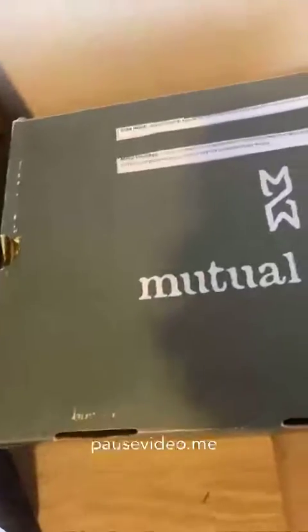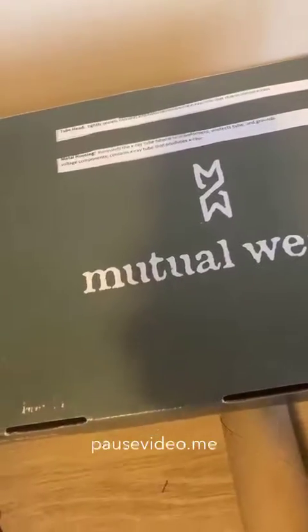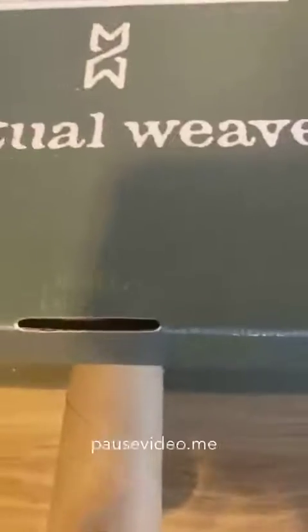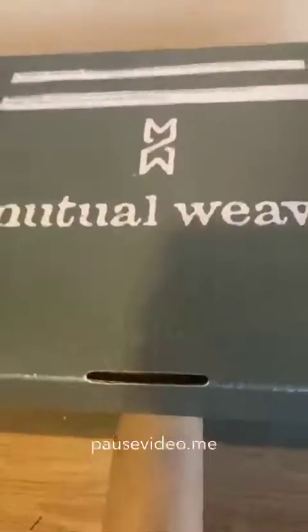Here is the tube head. The tube head is a tightly sealed heavy metal housing that contains the X-ray tube that makes the dental X-ray. The tube head also has a metal housing which surrounds the X-ray tube and transformer, which protects and grounds voltage components that contain the X-ray tube that produces the X-ray. Also right here is the PID.